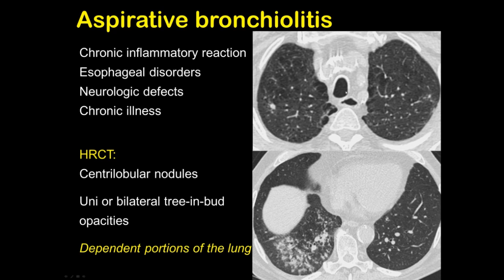In this patient we have esophageal dilatation, some centrilobular and paraseptal emphysema. We have a right upper nodule, and in the right lower lobe we see small nodules confluent in a patient with aspiratory bronchiolitis.